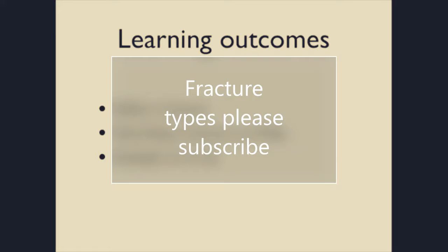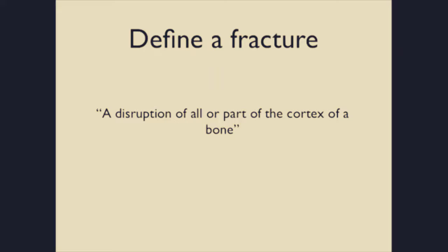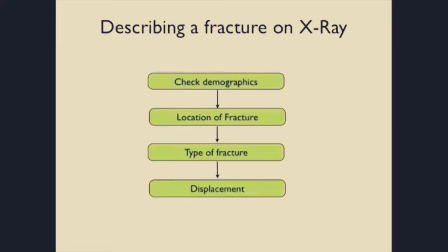Define a fracture, we'll describe some basic fractures on X-ray, finally looking at some examples. So to start with, just to clarify, a fracture is a disruption of all or part of the cortex of a bone. This is important and we'll refer back to it later.